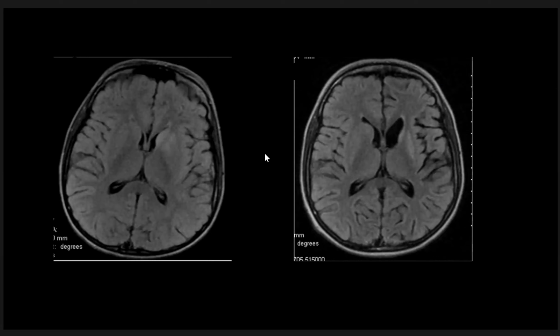And following the patient, at follow up after 16 months, we see dilatation of the frontal horn with atrophic changes of the caudate nucleus, but it still has hyper signal intensity, and also we have increased signal intensity in the lentiform nucleus, as we see here compared to the normal side, and with cortical atrophy of the left side.